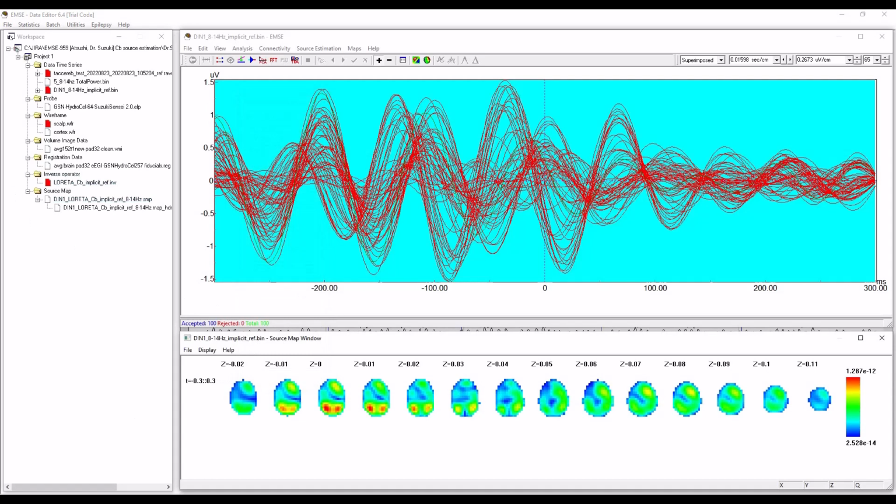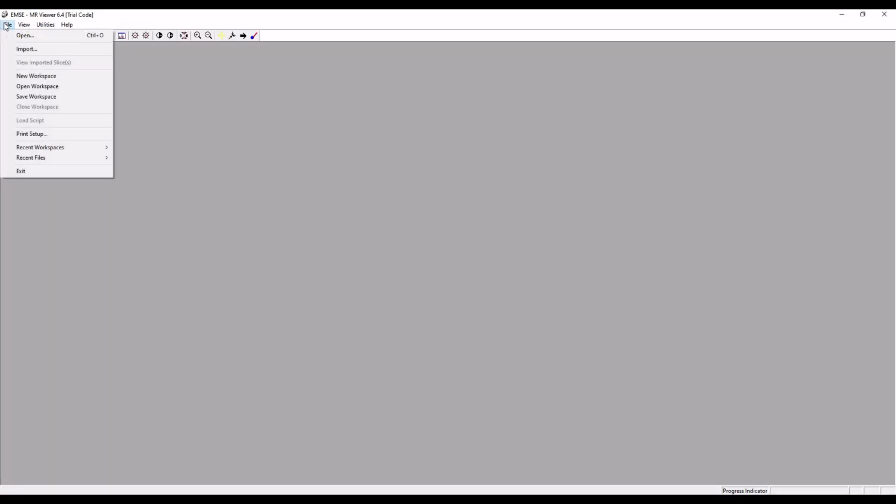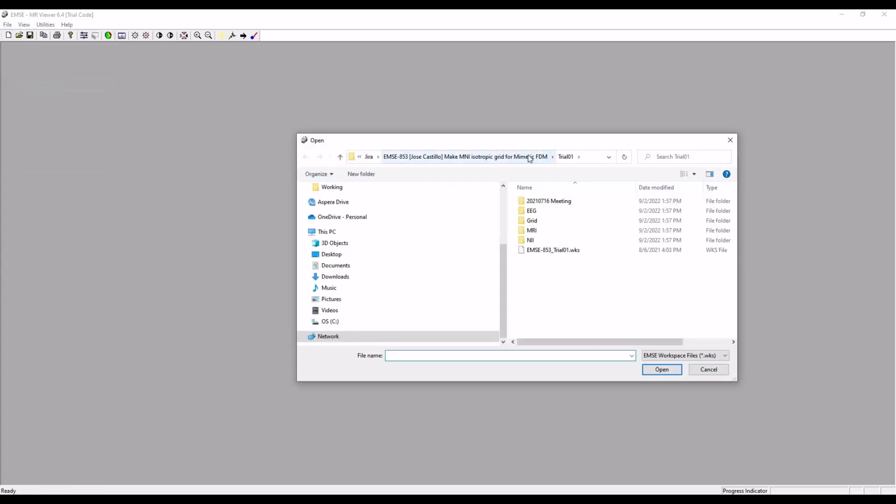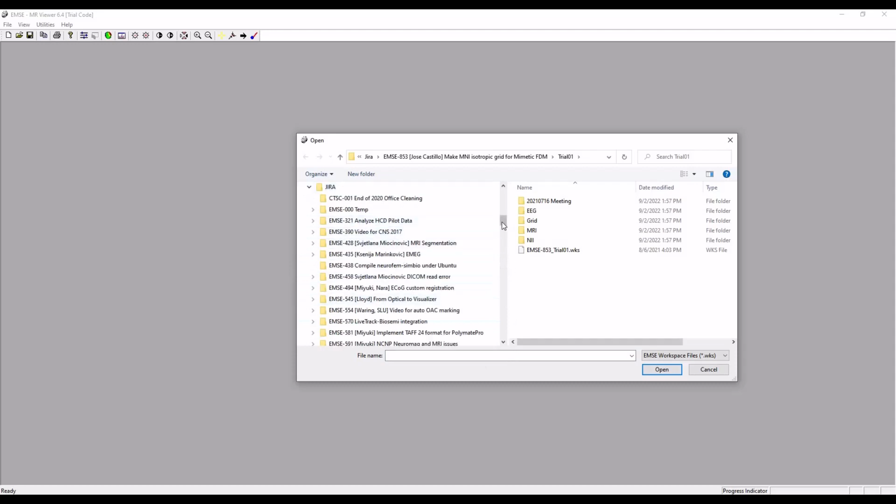Now when I go on the MR Viewer side, I'm going to load that same workspace that I just saved. So I'll say Open. Let's see, I may need to navigate there. Yeah, I'm in the wrong place, but I'll get there shortly.